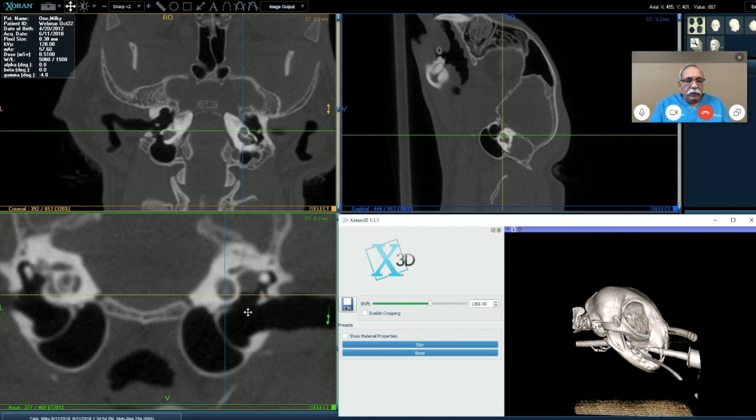Okay, so this is a feline CT. Feline has two chambers, the middle ear and then the bulla. The bulla is a big structure where the cursor is. Right between the middle ear and the bulla on the top area, there's a very small connection. The bulla and middle ear are connected in front of the promontory, the round structure right in the middle ear. Right in front of the promontory, there's a connection between the bulla and the middle ear structure.